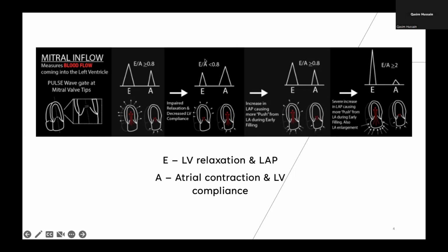Historically, prior to 2016, this pattern was considered the first grade of diastolic dysfunction, so patients would be given diastolic dysfunction based on this alone. However, in 2016, they reviewed a huge subset of patients in exclusively this group, followed them, and saw that there were unclear clinical sequelae from this group. They found that this could just be a part of normal aging. As you age, your left ventricle stiffens a little bit, and this doesn't necessarily mean you have heart failure or preserved ejection fraction.